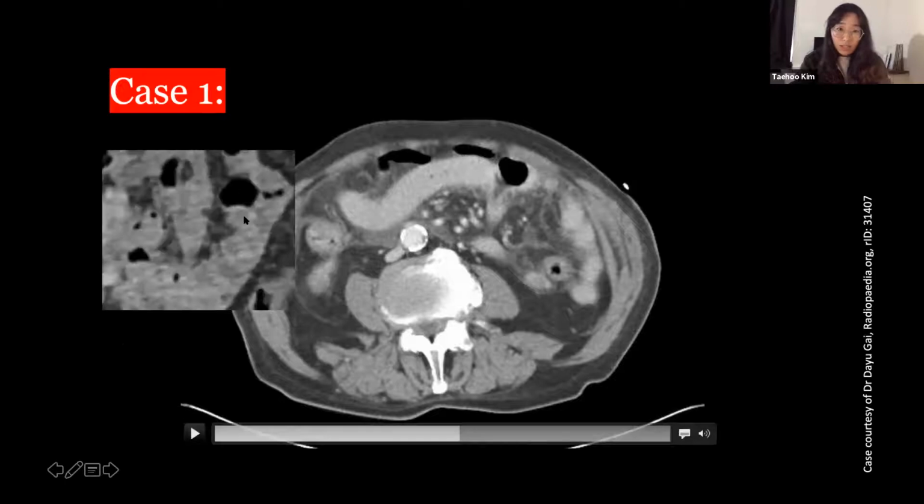Small bowel should look like this. It should have normal enhancing wall. It should be thin, shouldn't be dilated, and it should be free of fluid or air filled. No fecalization, no fat stranding next to it, no inflammatory changes, no free fluid around it. But here, it looks like a sausage. It looks very inflamed, edematous. I cannot differentiate between the thin enhancing wall and its content.